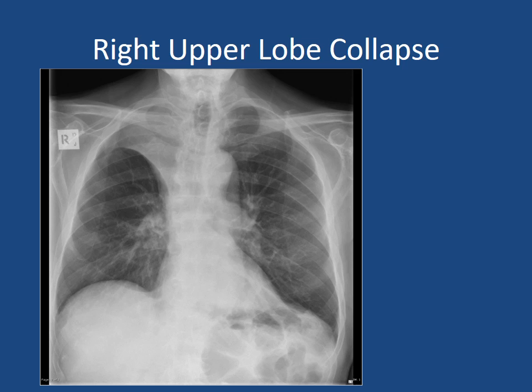And also now thinking about where we talked about the lobes of the lung, that will help us to identify what part of the lung has collapsed. What we're looking at is a collapse of the right upper lobe of the lung. So we're looking at this part here. This shows the area of the collapse. And you can see that it's not as dark as the air-filled lung that's around it. And that's because as it's collapsed, it now shows as more dense on the image.